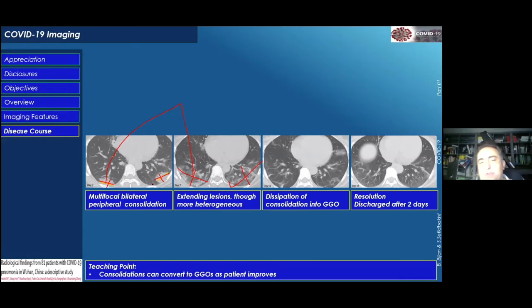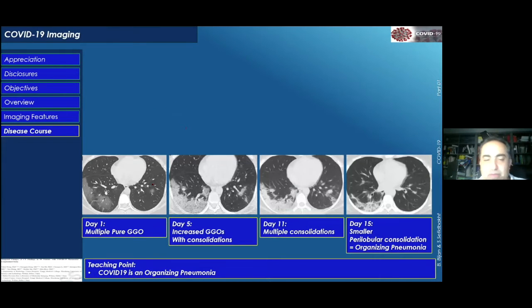So this is a very, very good sign, although in the report you may say more lung involved. But this more lung involved does not necessarily signify this is a bad condition. Maybe it's just getting better.